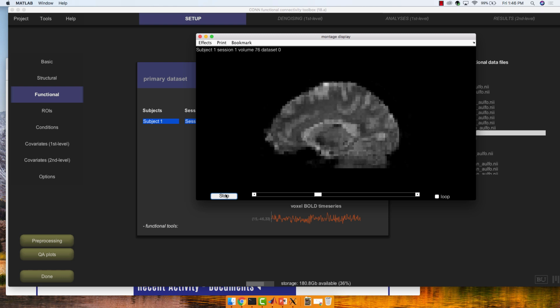If you want to go through it consecutively, just click on play. What else can I say about this? That's pretty much it. That's just a check I like to do to see what, if any, motion artifacts are there and what they look like.